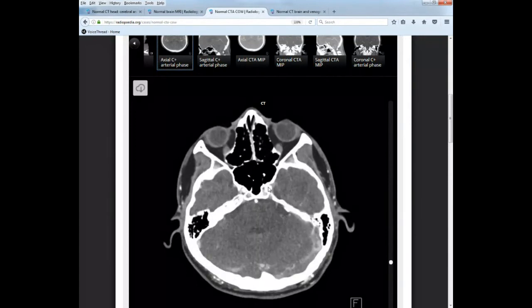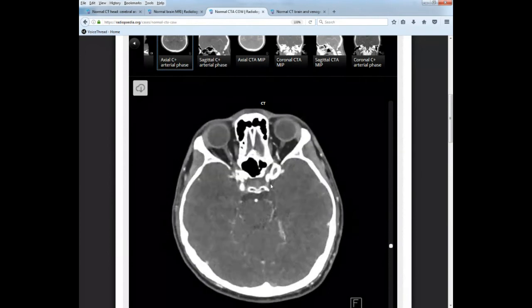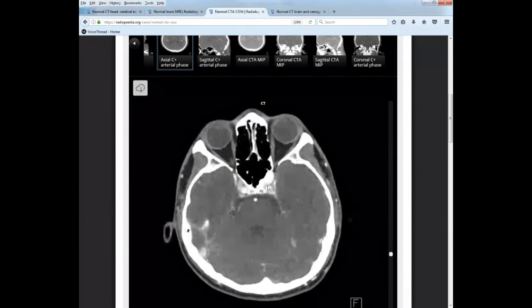Here are your carotids, right and left internal carotids. Now the carotids are going to start taking these crazy loops. Okay, if you look in your text on page 135, you can see, if you follow the carotid up, this is a sagittal view, it kind of dips down and up and down and up. So you can imagine if we're looking at this picture from an axial slice, you can see how the carotid is going to come in and out, and it looks really funny. It's not different vessels. This is still the carotid.